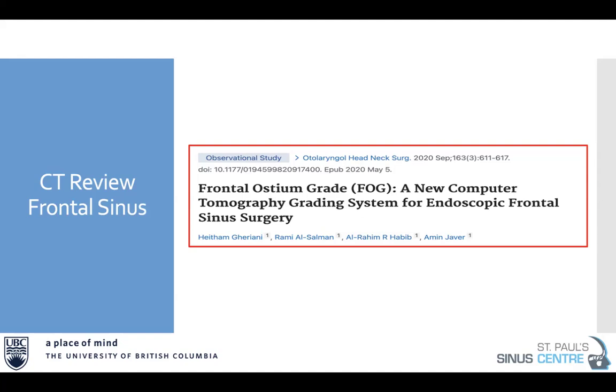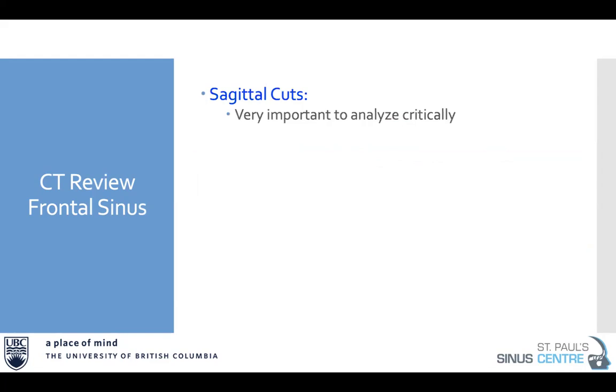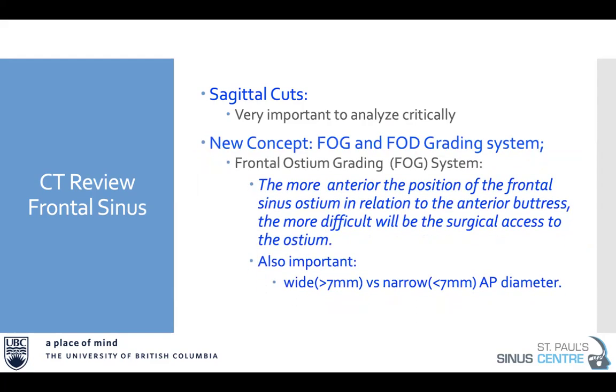We are now doing our phase 2 and phase 3 studies on this to try and do an AI generation to come up with a FOD for patients. So when you look at the CT scan, the sagittal cuts are extremely important in the frontal recess.